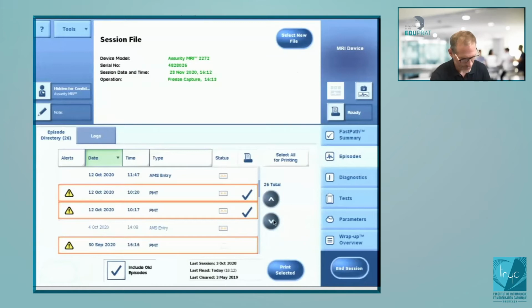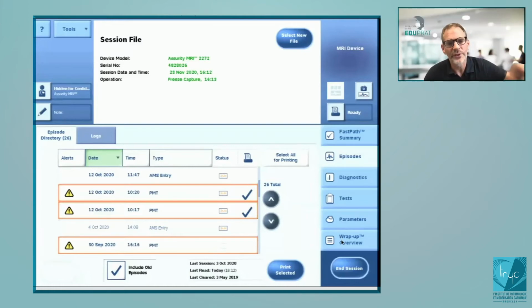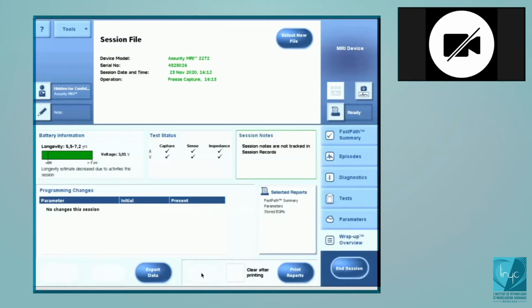Are there any questions? Just one little one. How do we reset the statistics? Because you've shown us how to delete the episodes. If you remember, ask me again. At the end, we will go on the simulator, and we will show you. Here it's not possible because it is a recorded one, but this is where you should click, and I will show you after. Do not forget to re-ask this question at the end of the session. Okay, thank you.